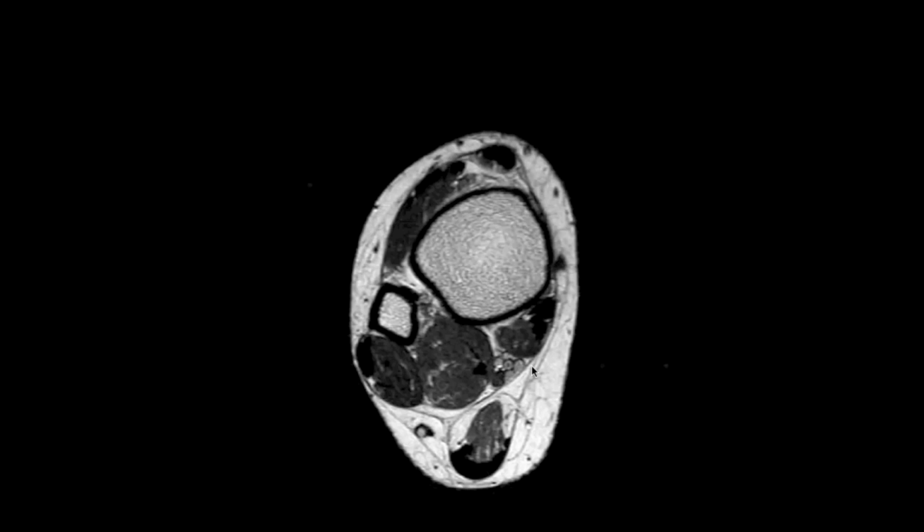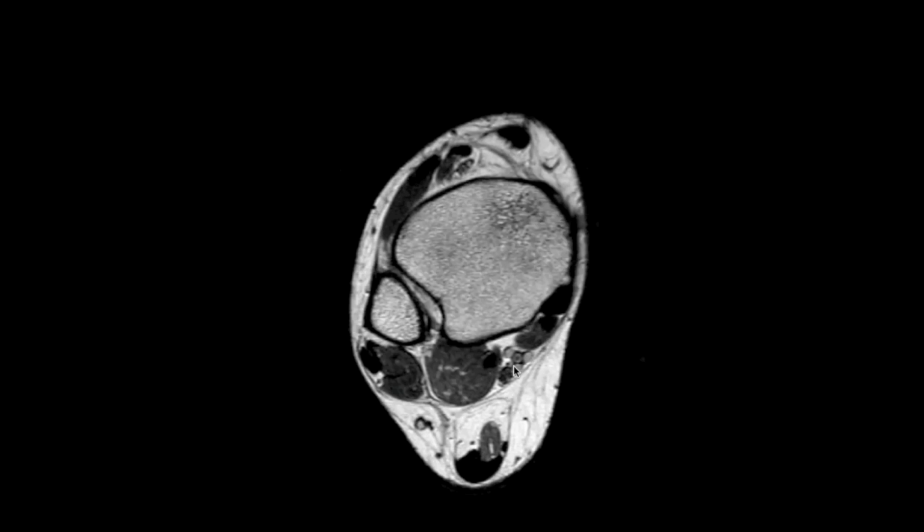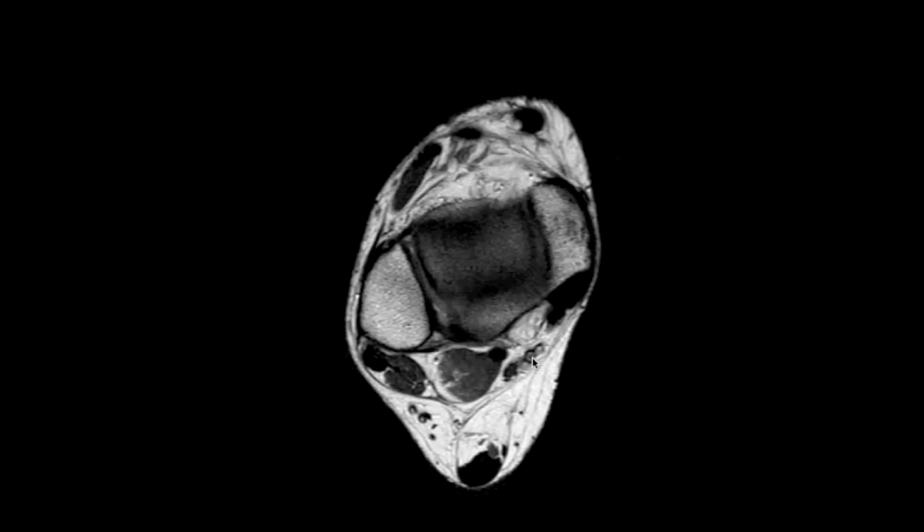All of these tendons are held in place by a flexor retinaculum, similar to when we discussed the superior peroneal retinaculum covering the peroneal tendons. We have a flexor retinaculum, and then between the flexor hallucis longus and the flexor digitorum longus, you'll have a neurovascular bundle which travels in a tunnel known as the tarsal tunnel, and this neurovascular bundle is composed of the posterior tibial artery with usually two posterior tibial veins, and then the tibial nerve.